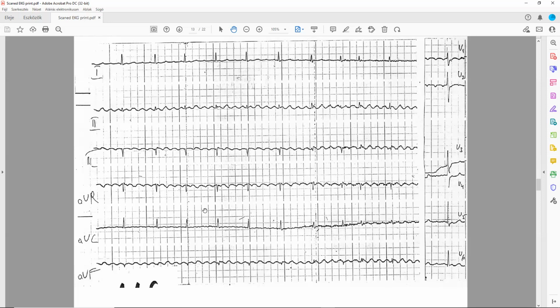It's page 13. I would say it is a regular rhythm, more or less. Yes, go on. The heart rate is around 70 beats per minute. Okay, that's good. That's not bad. It's normal. All right, go on. And the P waves, do we have them? It's a good question. It's more like an F wave. Yes, very good. Wow, you made my day.